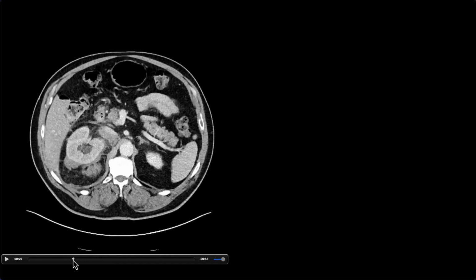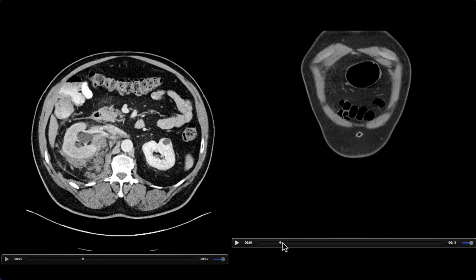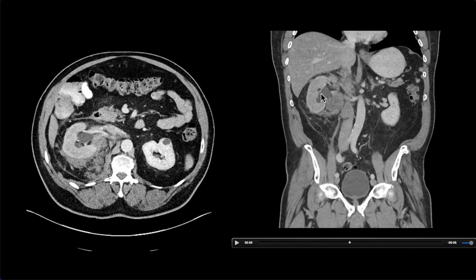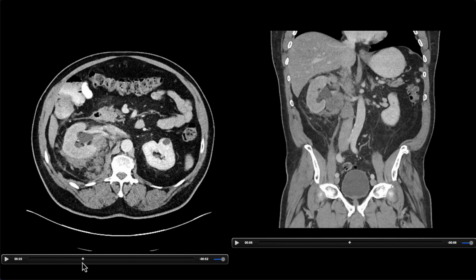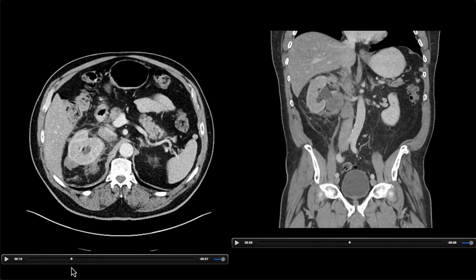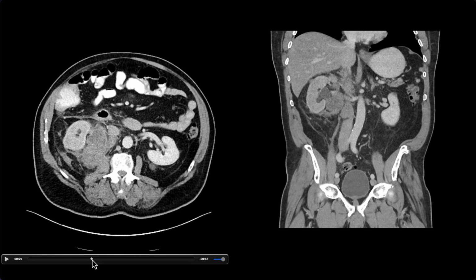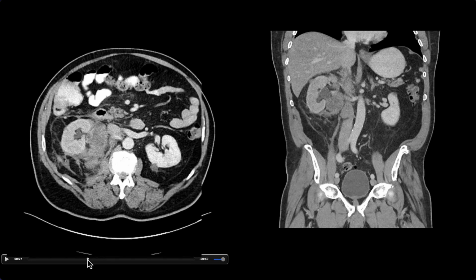And here we have another case of an unusual perirenal mass. So the kidney does look like it's partially obstructed. There's a delayed right nephrogram, and mild to moderate hydronephrosis. And there's also these perirenal lobulated masses that almost look a little bit like those plasmacytomas did earlier on, with this bulkier mass near the renal hilum.